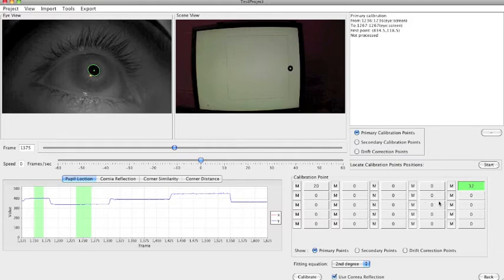I'm going to do a third one, which is here in the right, but in the middle of the screen. So I'm going to just go and click here, click mark, add some frames. Now unclick mark, scroll down here, select the center of it, and click done.